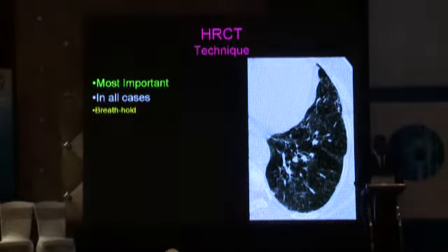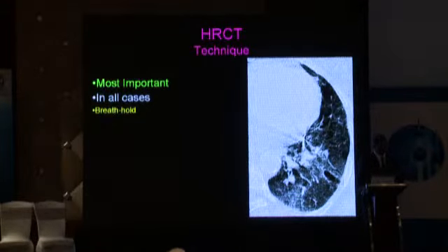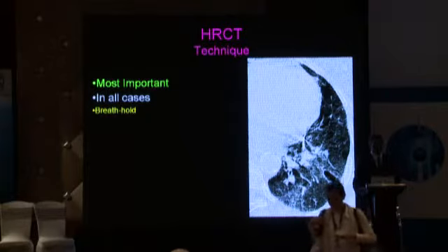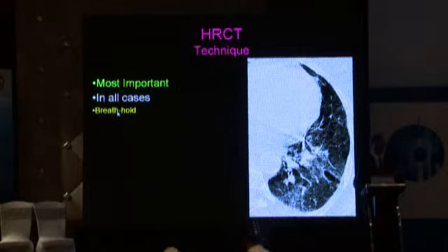If the image is taken carefully, this is what you would get. There is no ground glass attenuation here. Perhaps at the most there is a little bit of increased lucency, maybe some small airways disease, but this is the kind of image that we do not want. Having said that, a large number of imaging centers will produce images like this, perhaps because there is lack of time, perhaps we're not able to train our patients into doing something really, really simple, and that is breath hold.